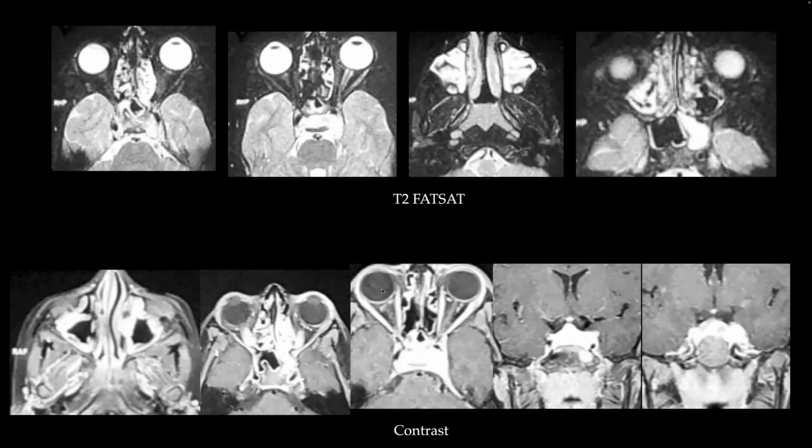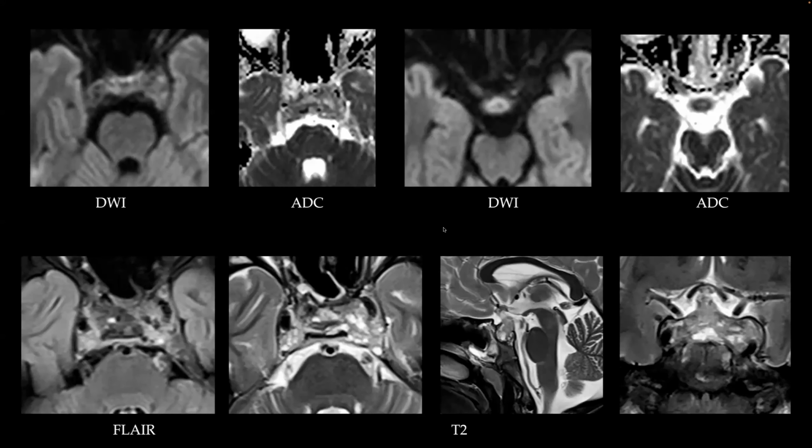They had prepared a wet mount, which showed, can we see the video? So I have the follow-up MRI at our center, again with additional sequences, the diffusions. The cavernous sinus abnormality demonstrates heterogeneous signal with internal areas of restricted diffusion. Also, the proximal optic nerves on both sides demonstrate restricted diffusion. There is sellar and suprasellar involvement of the stalk.